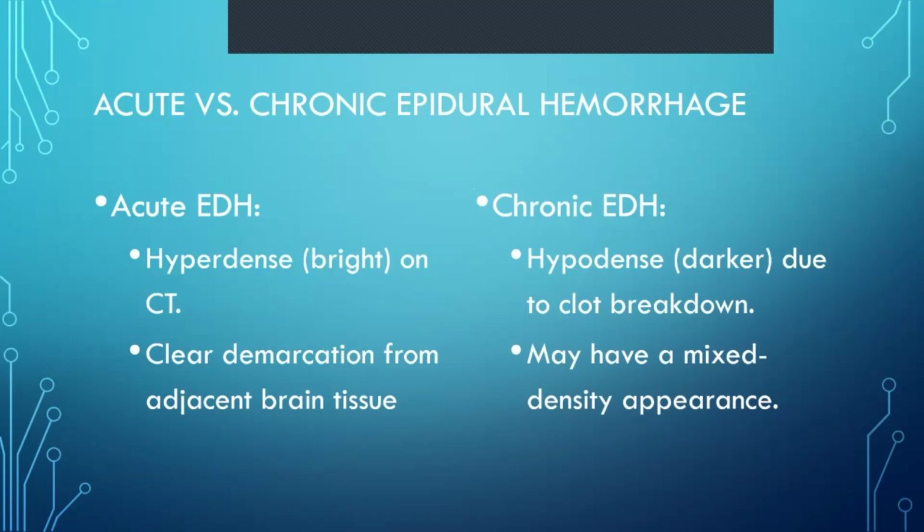And what applies for the acute epidural and chronic epidural sort of applies for all of them. And we're going to have a look at the two. And once you see the difference between the two, you'll be able to immediately make out the difference between them.